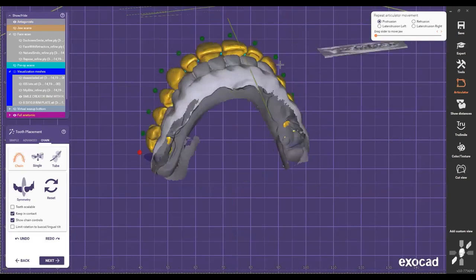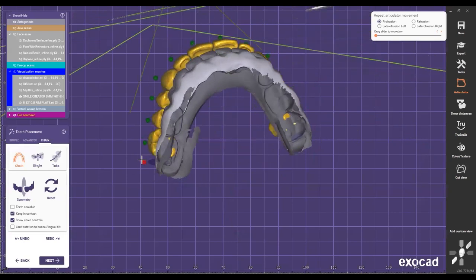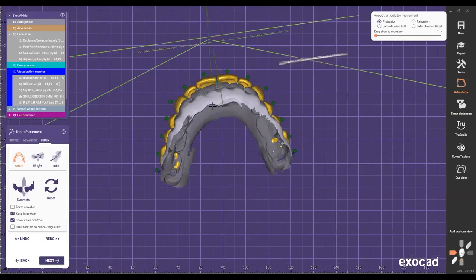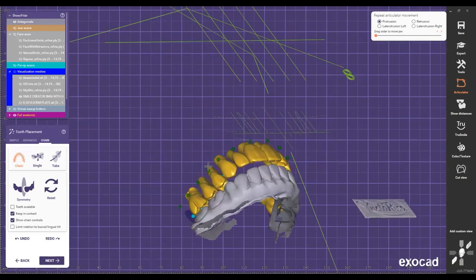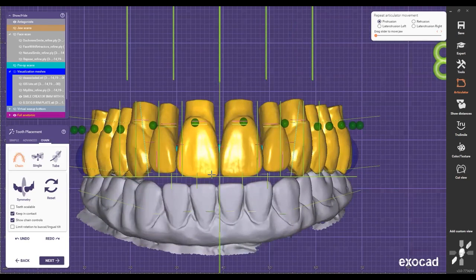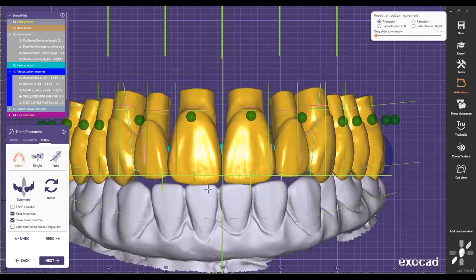So that means that I'm gonna have to just push him in just a little bit, because I want to make sure that I'm not gonna have that space right there. So I'll push him in just a little bit, just to kind of keep him close. And I'm just gonna go straight, move him down, and compromise a little bit there. I'm gonna try to keep him edge to edge, because otherwise it's gonna show the space right there.